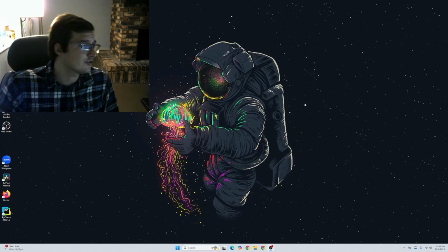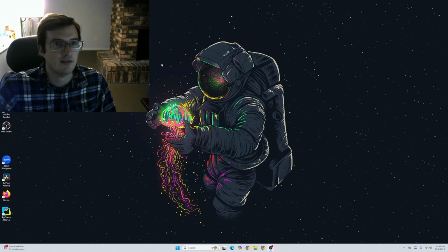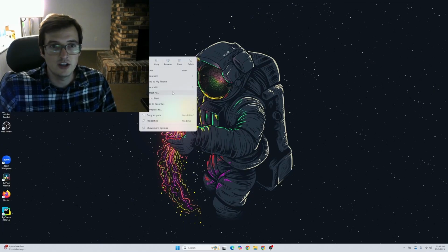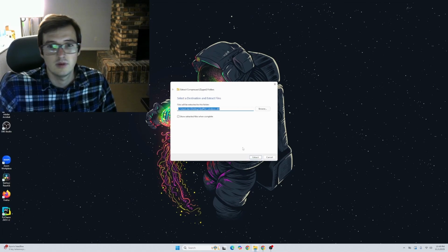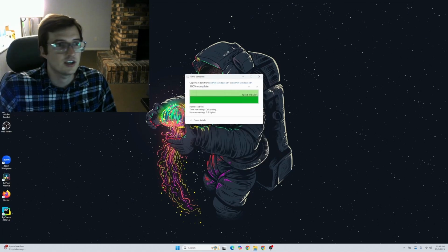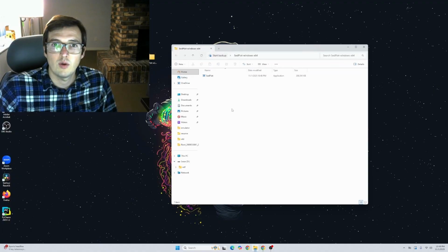I thought it would be interesting to open some data with SedPlot just so you can see and verify what's on there. So I have an older version of SedPlot available for Windows right here. So I will just unzip. This is a direct download off of our website. I would love to extract SedPlot right here. I will open SedPlot.